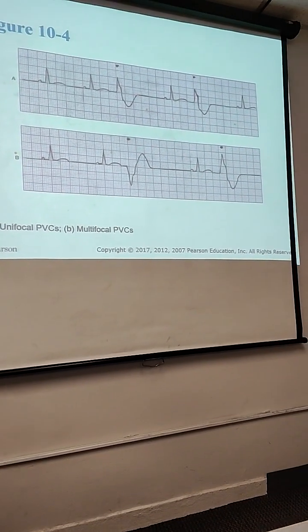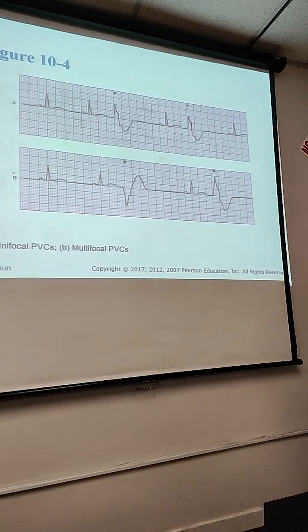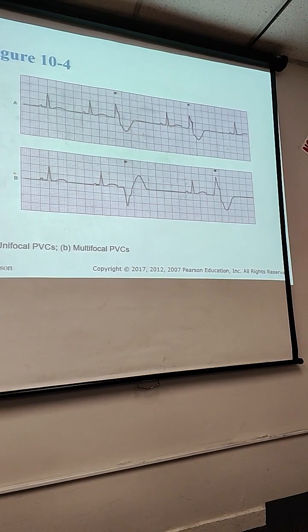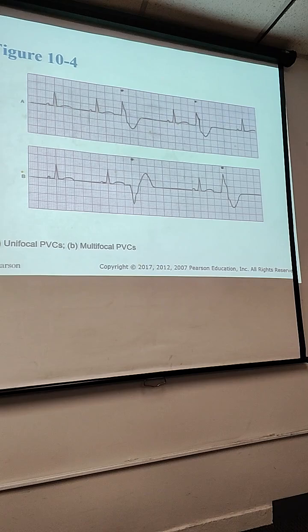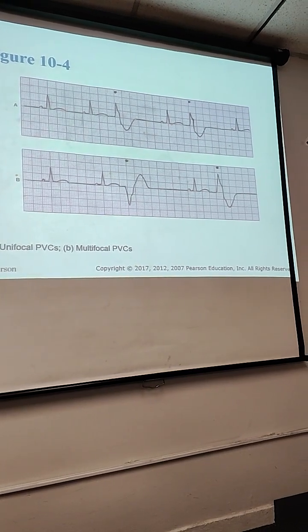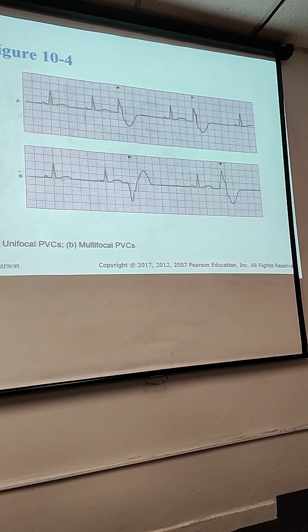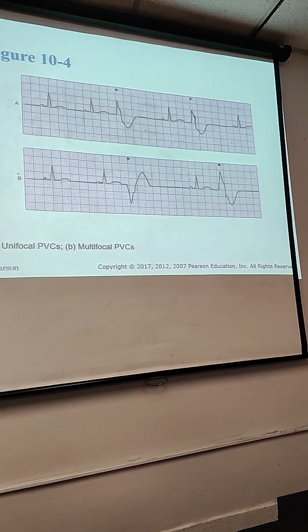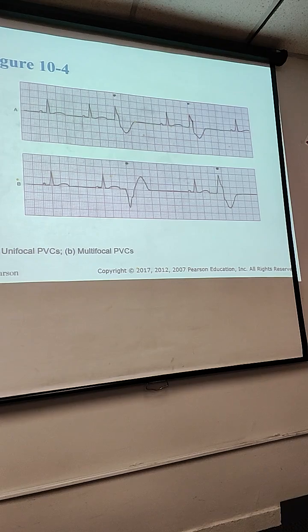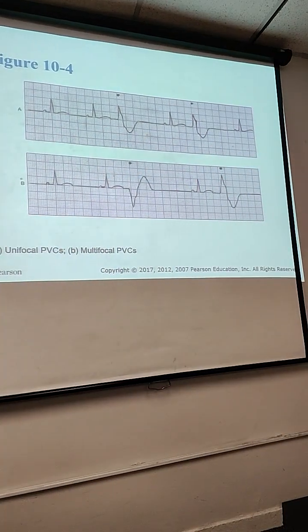What is the difference between this picture and this picture? I see more of the letter, the one on the top was the letter? The little point. What's that letter on the QRS? I see more QRS on the A one. Okay, you're not catching it. Check again. Let's see who catches what.